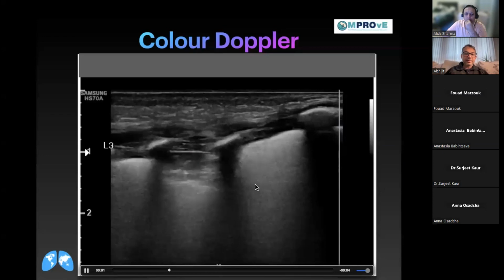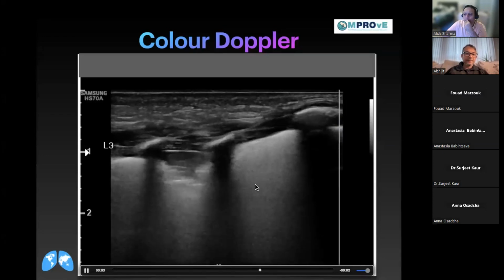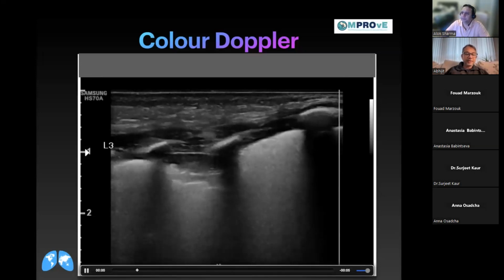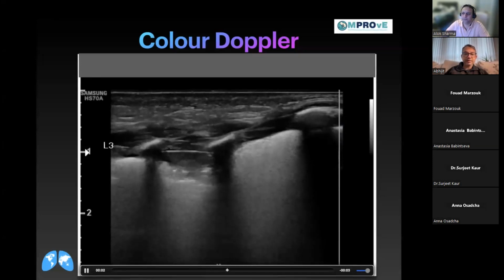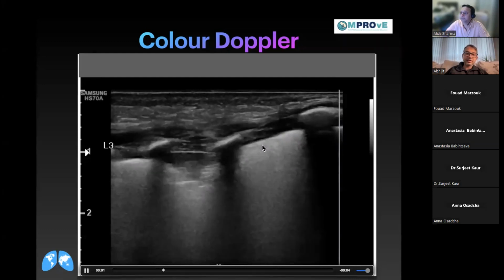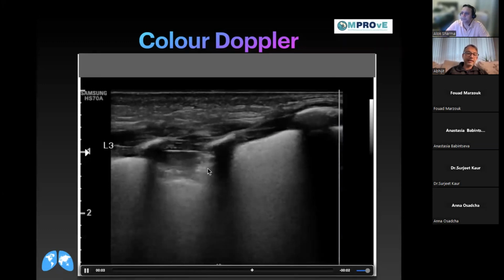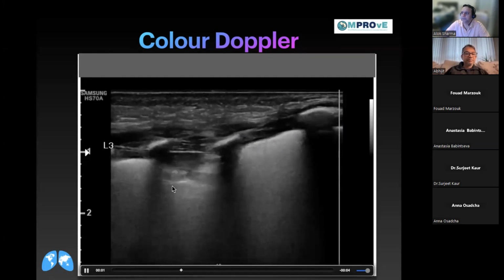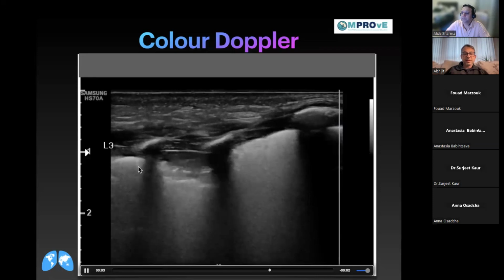Right. Another example. So this is a pretty white-out picture here. I don't know why it's not playing in a loop. Sorry about that. But you can see the smudged effect, and we can talk. There are some subpleural consolidations, bright speckles just down the pleural line in those areas, and you can see a similar kind of picture here as well.